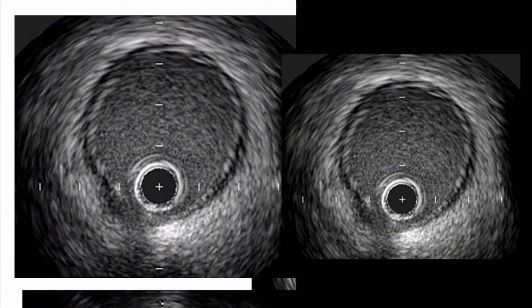Remember with the technique, we start from the inside, the innermost not necessarily being the center, but being where the catheter is. So in almost every frame, you should have a catheter and a wire. The wire artifact may or may not always be there, depending on what frame you're looking at, but the catheter should always be there. The catheter is a perfect concentric circle. You have some halos out here, but you definitely have a perfect concentric circle. That is the IVUS catheter, or OCT if we're talking about OCT.